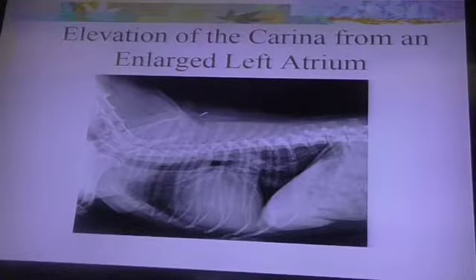Okay. I would take anywhere from a moderate to severe interstitial to a mild alveolar. And you actually do see air bronchograms, and you're seeing them right here. So the lungs are not so opaque that they look really beautiful. But you would be correct even if you said moderate. I take that as well. So which means then, your radiographic diagnosis would be left atrial disease with signs of left heart failure. That'll be your radiographic diagnosis.